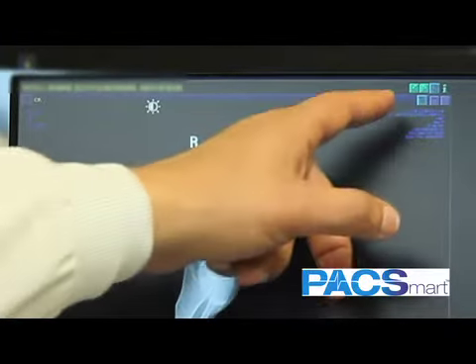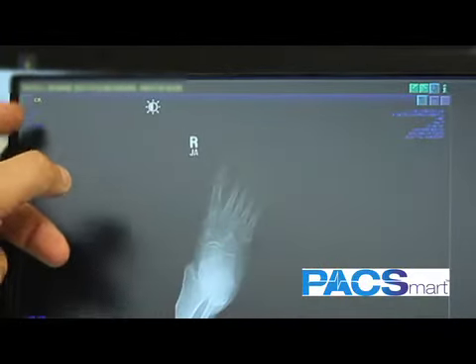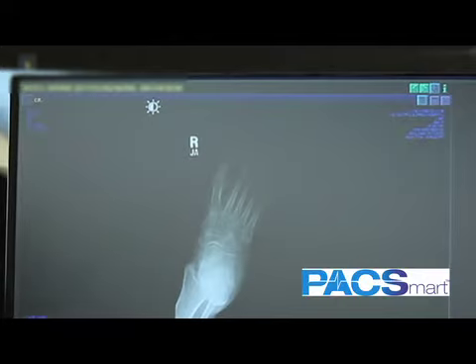What you'll notice in these areas blocked out over here and over here, we're actually pulling in all the information about the patient associated with that image. It has the facility the image was taken at, the date of the image, and the patient's name. This way each image is actually archived, and this is part of the DICOM system. With DICOM, all this information is actually tied to each image. You never have to worry about whose picture is whose.